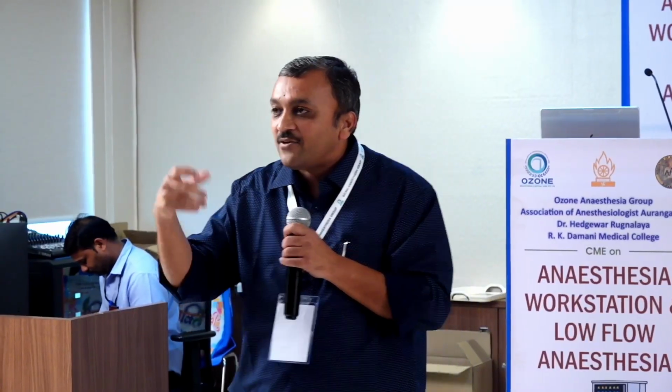As I said, sir, probably one of the important things is disconnect it, do an ambu bagging. Your hand is still the best thing. As sir was pointing out in his talk, it's not the machine which is the problem. It's that we are not able to understand or appreciate that thing.